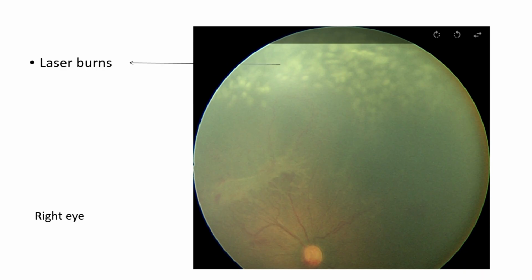So this sign, if you see, extraretinal neovascularization is there. If you see hemorrhages, that means it is stage 3 plus. If you see hemorrhages, if you see these lesions behind the ridge, even if you don't see this, then you should assume that this is a stage which will need laser. If there is no plus, you observe, but closely observe. But if there is plus, you treat straight away.